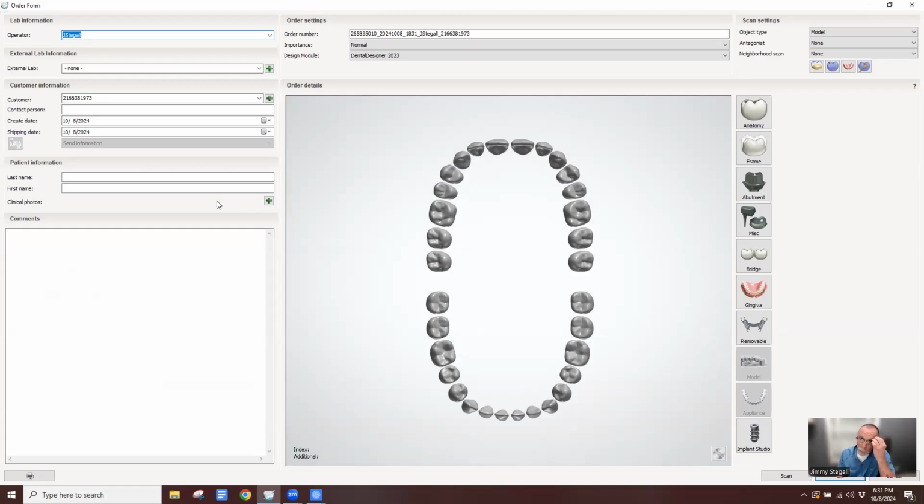But you could also use it, like I had a prosthodontist who did his own wax up, did a lot of carving and shaping and festooning in the wax. And he took an impression wash in that wax up, and I used the copy denture workflow to go ahead and make the denture from his analog wax up. So that was a pretty unique use. And there are various other workflows in the implant workflows. It's just a good, simple workflow.